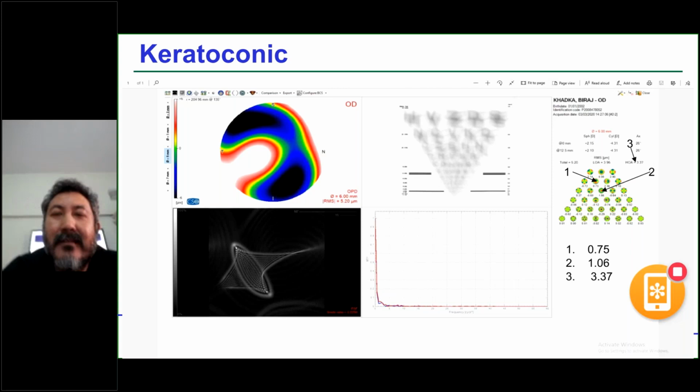It is very important to take all your scans because you may have subclinical keratoconus hiding there. I would be very worried about patients with VKC, because even after surgery, if they keep rubbing their eyes, these people have a rougher cornea, the tear level and smoothness are not good, and this is why they have high order aberrations.